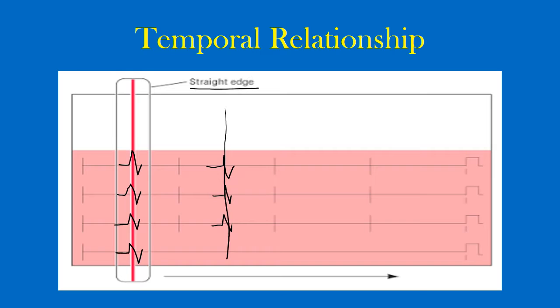So it's important to remember that this is a continuous time as we move left to right across the EKG strip. So again, the events that happened here are not happening at the same time as here. But the events happening here are happening at the same time here. This is really important. It shows the importance of the rhythm strip.